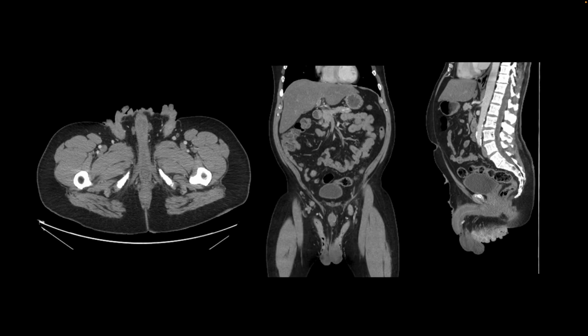This is our next patient. The finding is incidental. We performed a CT abdomen and pelvis to look for a cause of abdominal pain, and we incidentally found skin thickening involving the inguinal regions bilaterally, also seen here and in the midline extending into the perineum. There are these verrucous growths, and these are from condyloma acuminata. There are some regional reactive lymph nodes as well.